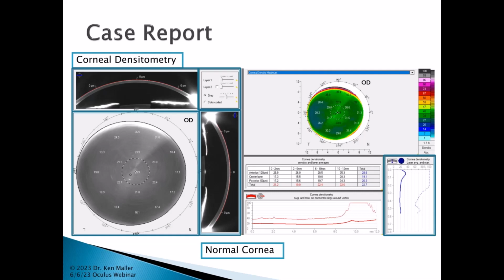And going from the top, where it says 0.0 on the left side of the graph, down to, in this case, about 550 or so, is referring to the depth of the cornea. In this case, it's about a 550 micron depth cornea. And you can see how it transmits through all of those layers, with the most reflectivity really up at the top little portion of that blue graph.